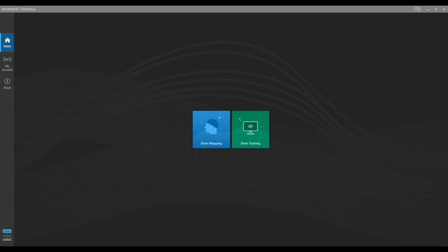Of course, all the thresholds are paused. Therefore, there is no data being fed into all those numbers at the bottom of the screen. So with the NewMind software, when we end our session, all the data in front of us is the actual good, clean data of how they trained. That lets you know you're on track with them.